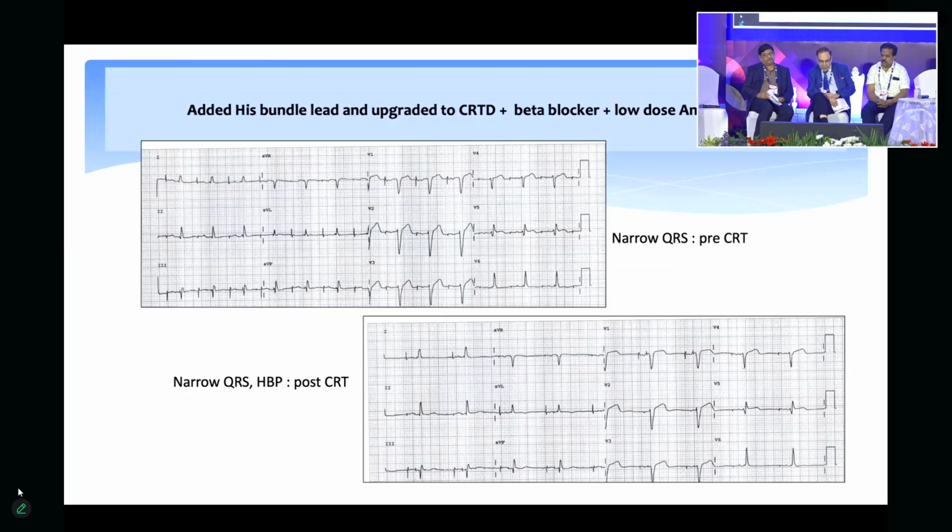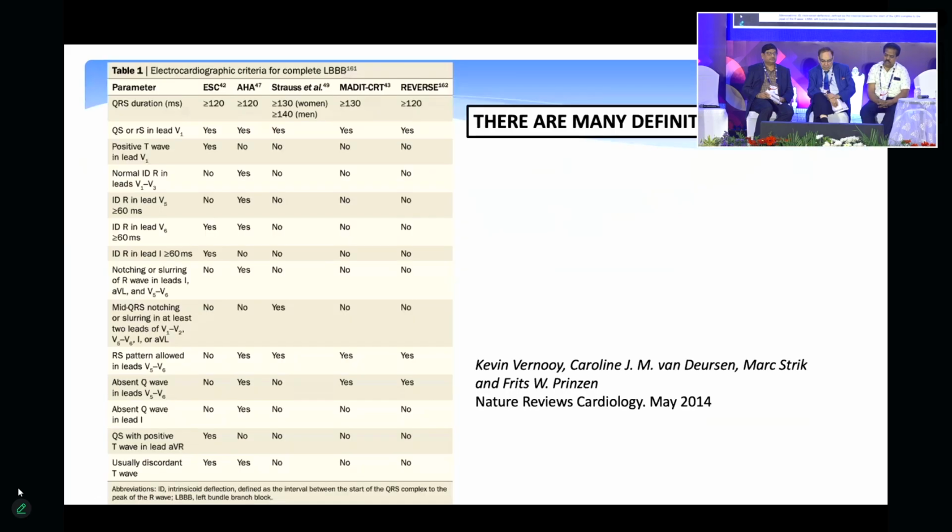So that's the importance of looking at the ECG before the CRT to decide which type of pacing to give. And this patient had an extensive septal scar, as you can see. So left bundle pacing, like you just listened, is unlikely to work in these cases.